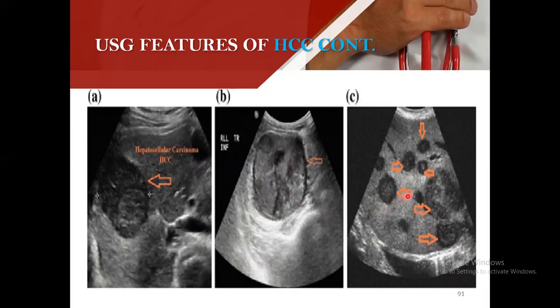This one looks like lymphoma, which looks like lymph nodes in there. However, these are diffuse. They are diffused, that's what we call diffuse. They are distributed in there like that. Those are our cancer tumors.